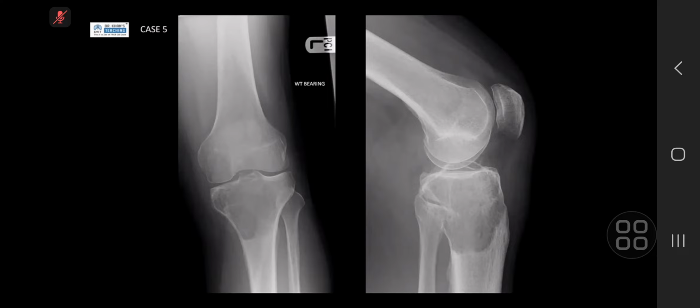Okay, good. Can you talk to me a little bit? You said narrow zone of transition. Can you talk to me a little bit about the lateral margin of the lesion? The lateral margin of the lesion is not sclerotic. There is no sclerosis surrounding it. However, I see it partially sharp or partially irregular. It's defined partially. So is this confusing to me as narrow zone of transition here in the lower border of the lesion? Okay. And what do you think about the cortex of the medial proximal tibia?